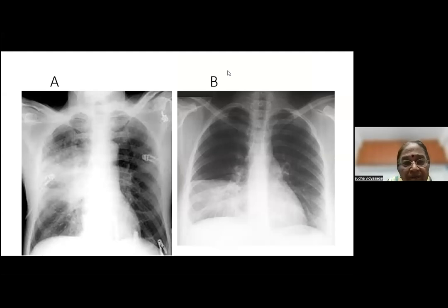So we should be able to get this right. X-ray A and X-ray B. Yes. What does X-ray A show? You want X-ray B? It's easier. We can go to X-ray B.